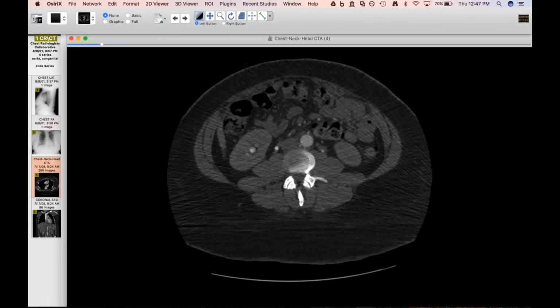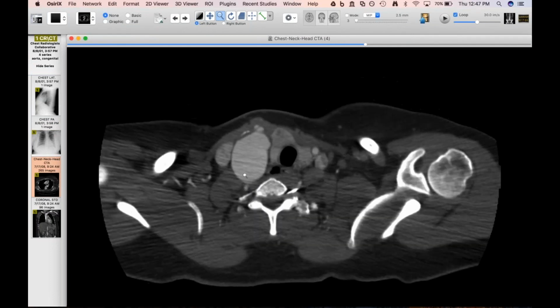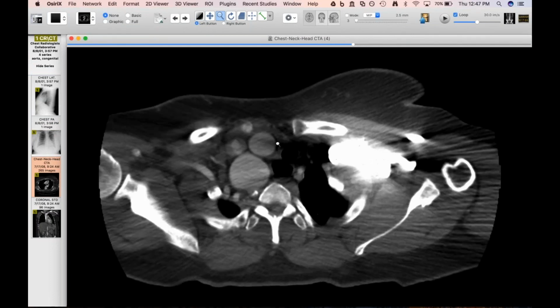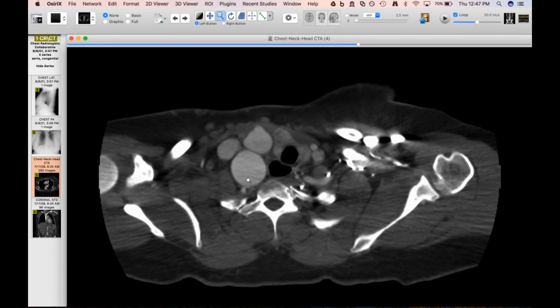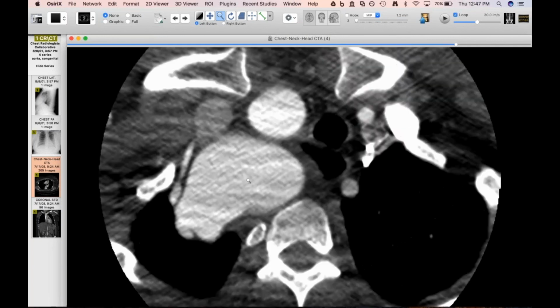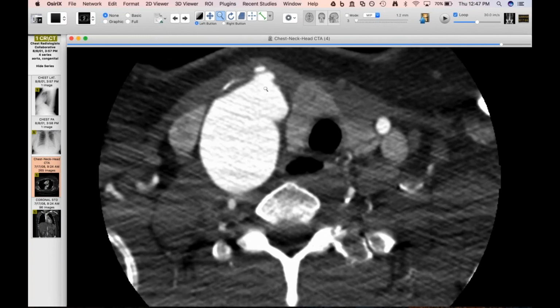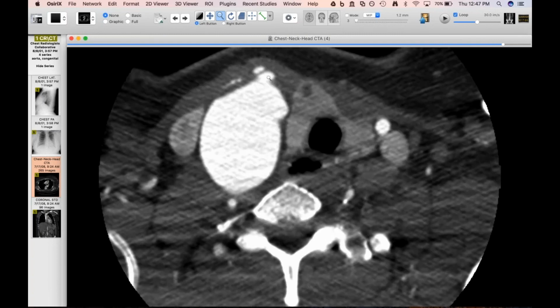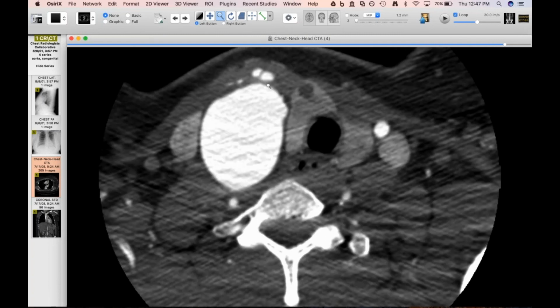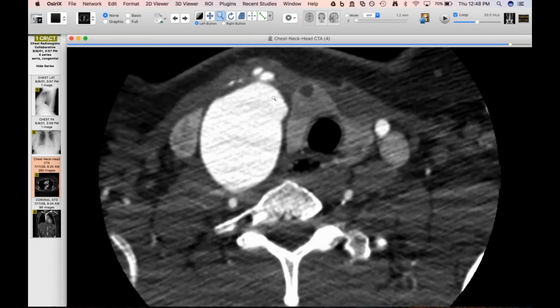Thanks, David, you were the one that pointed this out, but here's this patient's arch. And I agree, without a doubt, this trumps mine in terms of how high up it goes. So certainly they're different. But in this case too, David, if you look on the neck, you see separate origins of the right carotid, internal and external, as you typically see with a cervical arch.